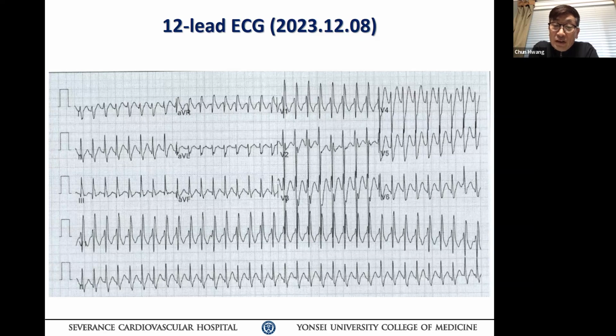그 다음에 V6 가시면은 V6 second to the last, 맨 마지막 2 second beat 봐봐. V6, 그 위에 바로 그거야. 가봐 V6. No, next beat. Yeah, 올라가. Is the same as the other guy? V6. Precordial V6. Yes, that beat. Look at the initiation, how they start. There's no Q wave in this complex. Other ones, they have a Q wave. 없지?